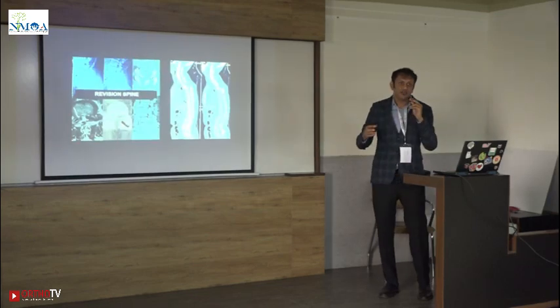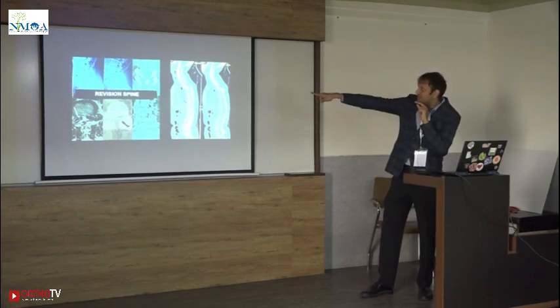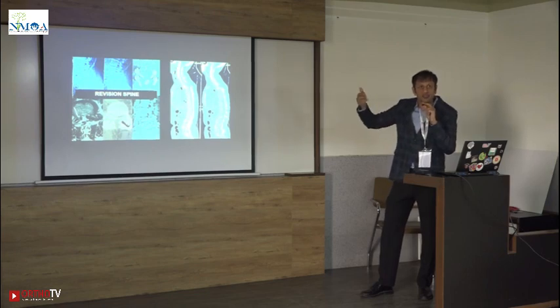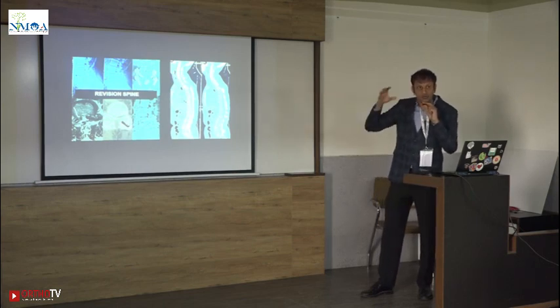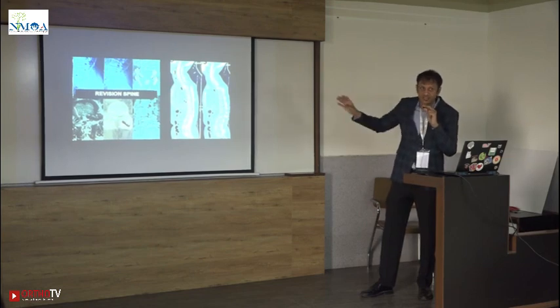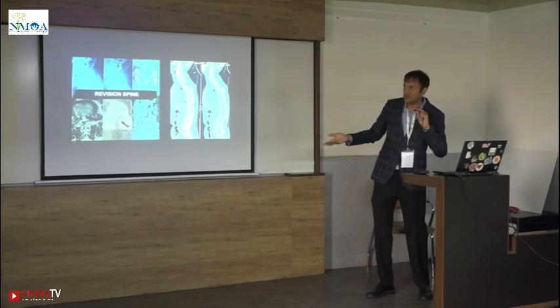Again, CT scan is a no-brainer whenever you attempt a revision spine because you want to know your bony landmarks. Now, that patient had come with a pathological fracture elsewhere, they just decompressed it only to realize that it was a thyroid met. Now she comes to us with this picture and you should know what you are dealing with. You should know your bony landmarks before even attempting these surgeries because that would help you and ease your intraoperative skill.